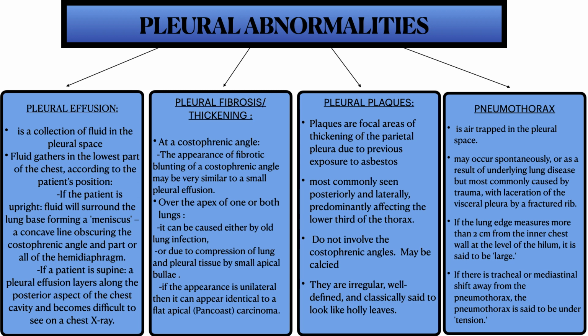And if the patient is in supine position, then the pleural effusion will not be visible, and it will be very difficult to detect, because the effusion will layer along the posterior aspect of the chest cavity.